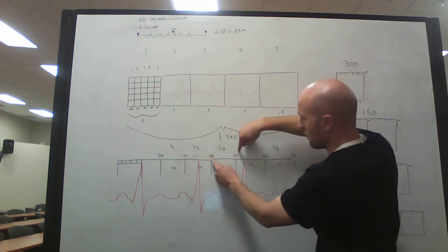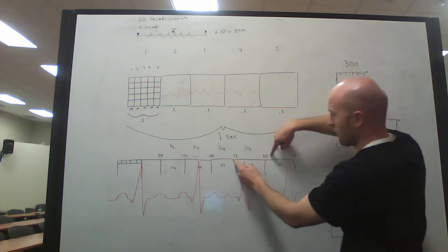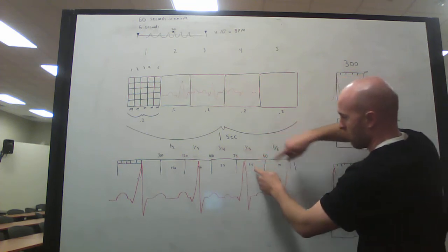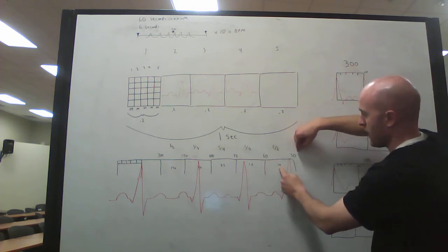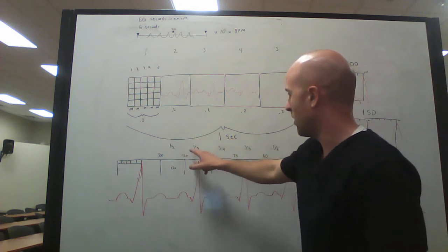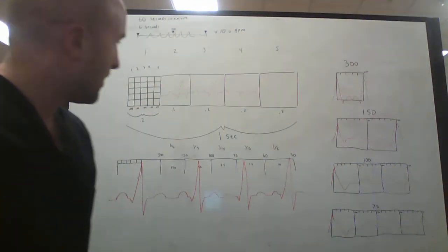Over here, the difference between 75 and 100 is 25. If you take 25 times 4, because it's 1/4, it would be 100. Over here, the difference between 75 and 60 is 15. 15 times 5, for 1/5, would be 75. And the same thing over here, the difference between 60 and 50 is 10. If you multiply times the 6 for 1/6, it would be 60. So it's just using the concept of fractions: 1/2, 1/3, 1/4, 1/5, 1/6, going down, and that's kind of the why it works. And hopefully that is helpful.